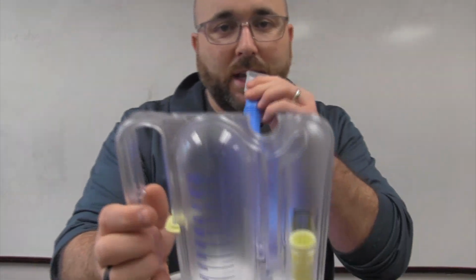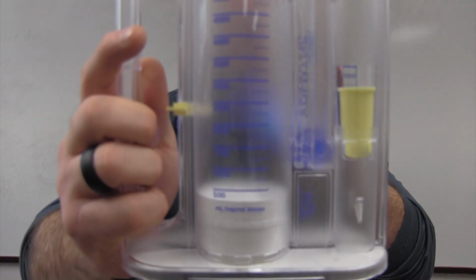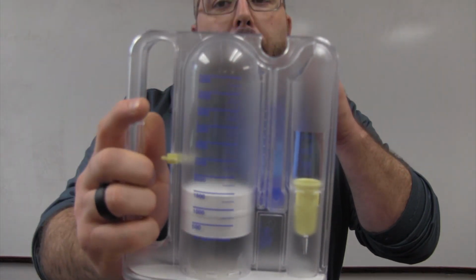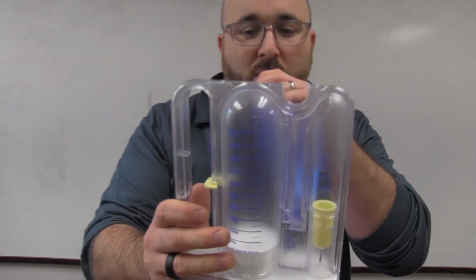now release. And you notice that I kind of pulled it out of the camera a little bit. I'll do it again. You're going to watch me hold the breath while the bell falls. And a slow release. And what we see is that you recruit the most alveoli when you do that breath hold. Just doing this is one thing, but holding it is where you're going to recruit alveoli.